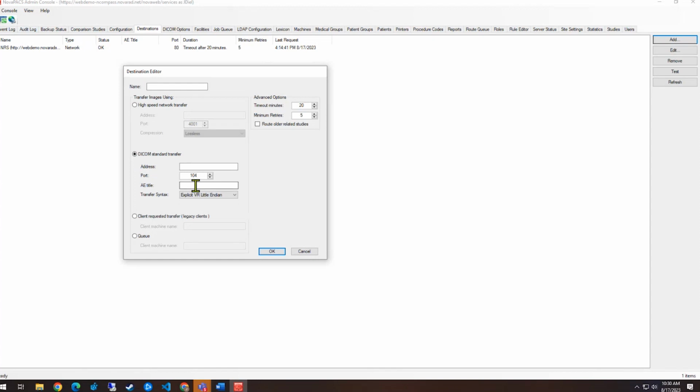The thing that you may need to look at, and again, this has been simplified in later versions. Before we had quite a long list of syntaxes that you could use. Now we just use 3. If you want completely uncompressed, you have implicit and explicit. If you're looking for any sort of compression, then negotiated is the way that you want to go. And the way that this works is we actually have a list that we send people when we do that negotiation saying, hey, for that CT that we're trying to send you, these are our options for the different syntaxes that we offer.